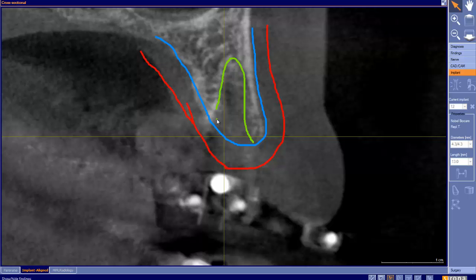These are important things to look at as we're planning. So I like to always begin by understanding what it is I'm looking at. Hopefully that is helpful as we move forward in the planning process.